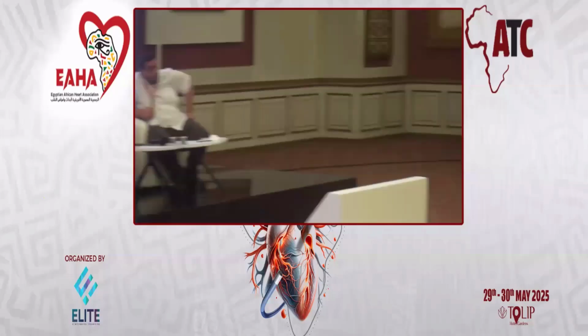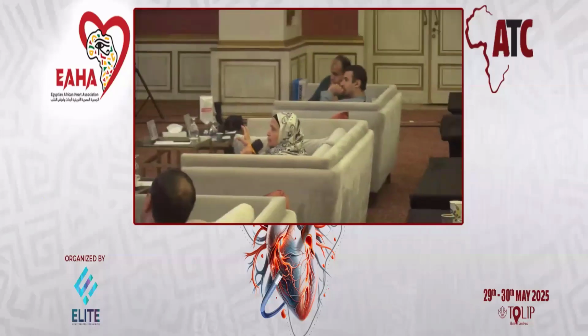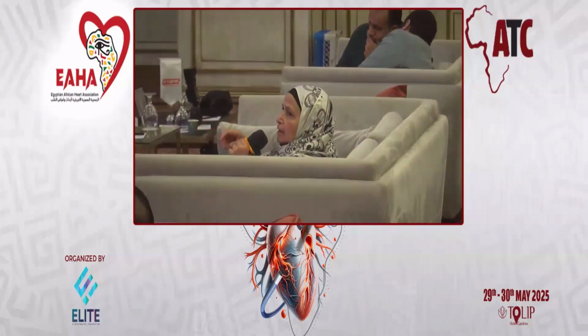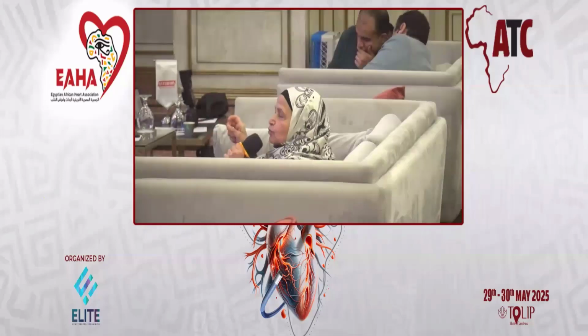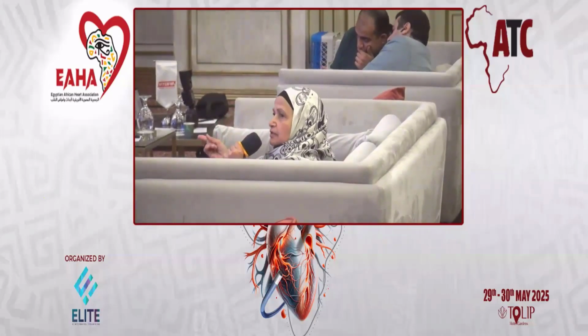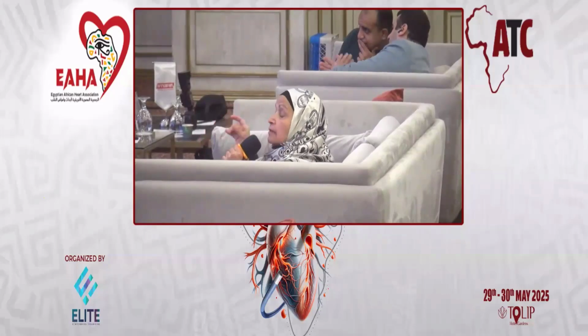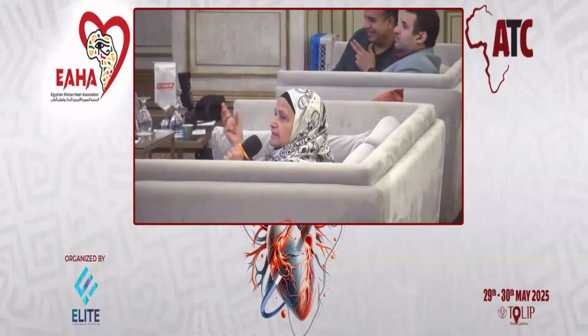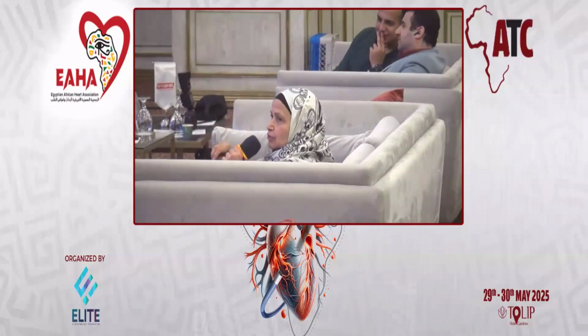I can add something about the clinical situation of the patient. Don't interpret only the machine. You have to ask the patient, when you received the shock, what were you doing? Running, fighting? And when you receive the shock, look at the electrogram immediately after the shock. Is it back? Sometimes they go back to sinus rhythm from the shock, from what was thought to be VT, which was not VT, it was atrial fibrillation.